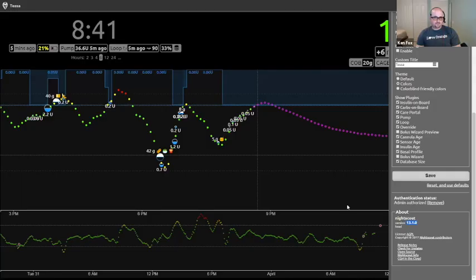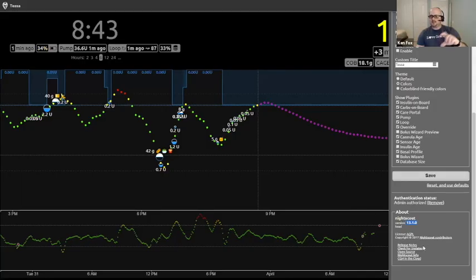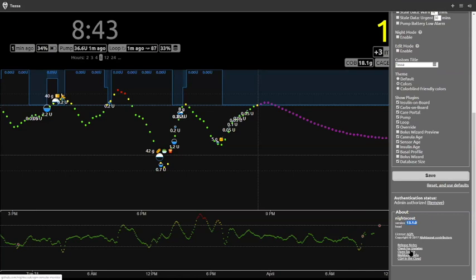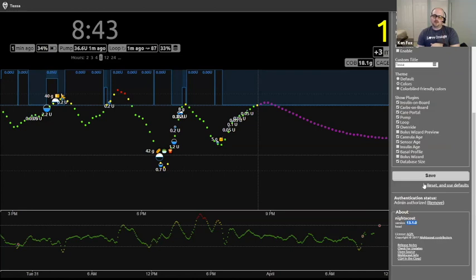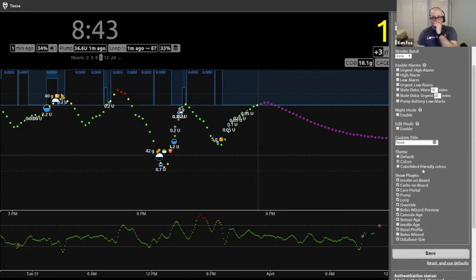Okay. So one comment, Kenny, yes, is if you are looking at other people's Nightscout site, and they have an alarm go off, don't silence it, because it turns off the alarm for everybody. So if they were wanting to use the alarm, good point. Don't silence it. Just come in here real quick in the menu and uncheck all the alarms, and then go down and click save, and then it'll stop beeping at you. And then you won't be messing them up if they were expecting an alarm.